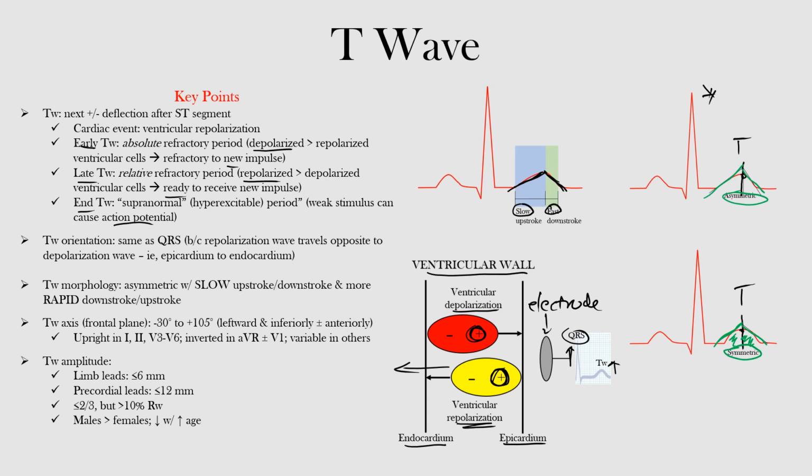And when we talk about amplitude, we're simply talking about the height. So let's just erase some of this here. When we talk about the amplitude, it's this portion here. That's our amplitude of the T wave from the top of it, the apex, to the bottom. Okay, so let's briefly review what we discussed before we end here.